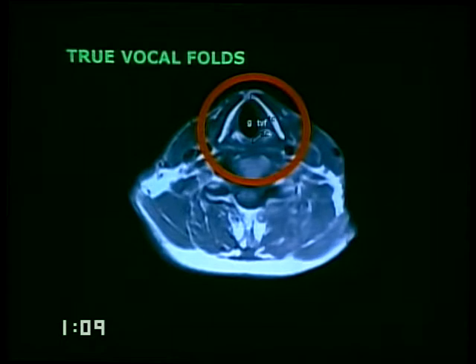The importance of MRI: you have fat around the cartilage. If the fat is invaded, if the fat is destroyed, or if these cartilages show abnormal enhancement, then you know that they have been invaded, they have been violated, and it upgrades the tumor.